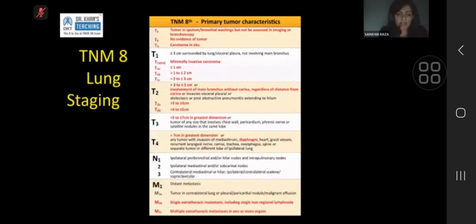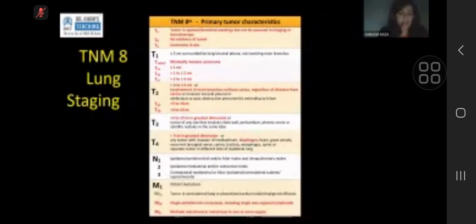You have an incidental finding of lung tumor. The things to remember most importantly are the T4 features, and for the purpose of safe reporting, we want you to know what to look for in central tumors. So SVC obstruction is a life-threatening condition that should be picked up and can be a complication of T4 lung tumor or central lung tumors. So don't be too put off by this.